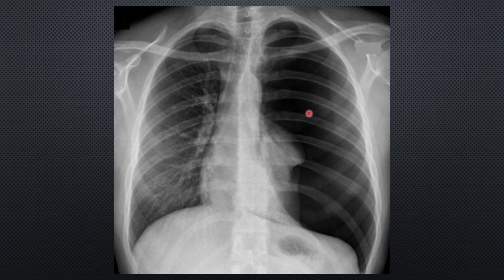And the heart is shifted to the other side. So you've got tracheal deviation. You've actually got mediastinal deviation as well. So the heart border is all pushed across. And so the left lung is very, very tiny. If anything left of it, it's all moved across because of the tension pneumothorax all on this side.